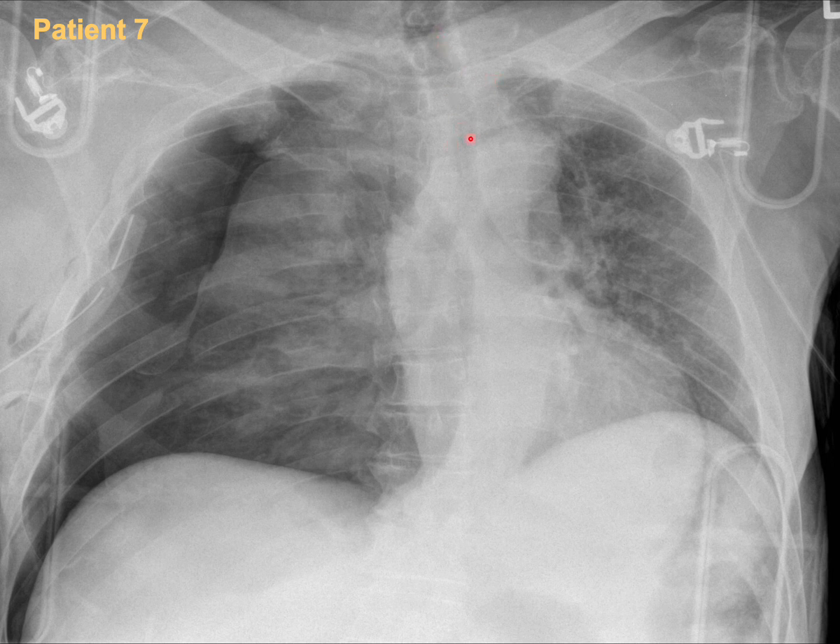I think all of us can appreciate that the heart is pushed to this side, and this is what we called earlier the deep sulcus sign. If you look here in comparison to here, it's a very deep sulcus on the right side. Okay, so our diagnosis here is persistent pneumothorax with chest tube on the right side, possible chest tube malposition or malfunctioning, and multiple rib fractures on the right side as well.